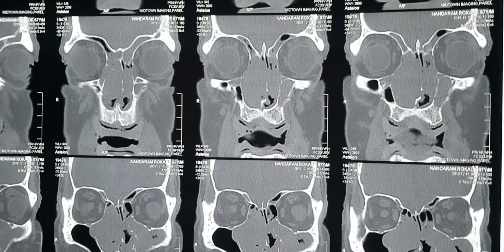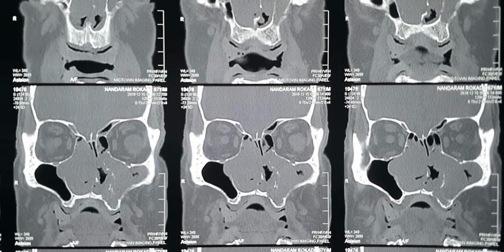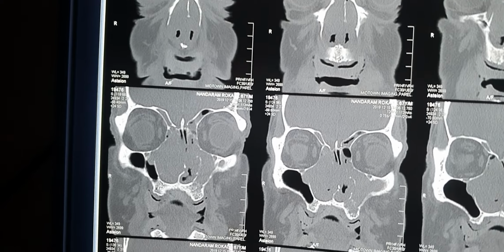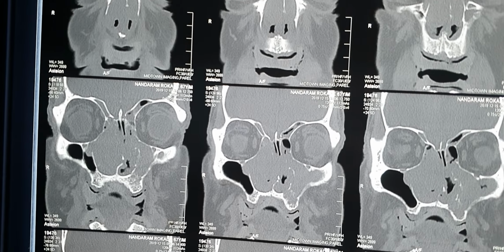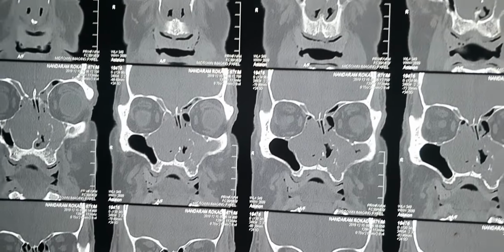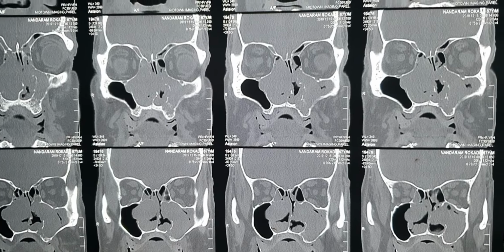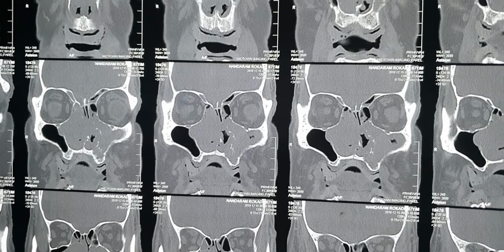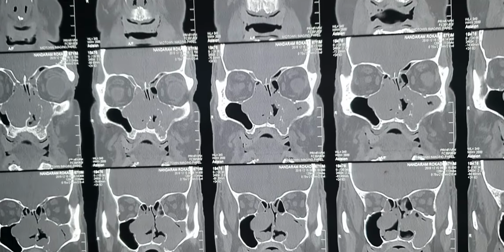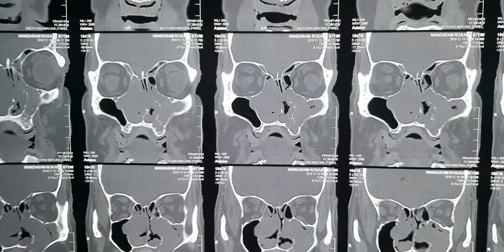In that distorted anatomy, how can you identify the exact structures, whether this is the anterior ethmoidal artery, the anterior ethmoids, or whether you have entered the posterior ethmoids, where are the limits, where is the lamina papyracea, how the transition from the anterior to the posterior occurs, where the sphenoid starts, where exactly is the osteomeatal complex, the septum, whether it is destructed, eroded, everything. So certain anatomical landmarks you have to keep in mind before you read a CT scan.